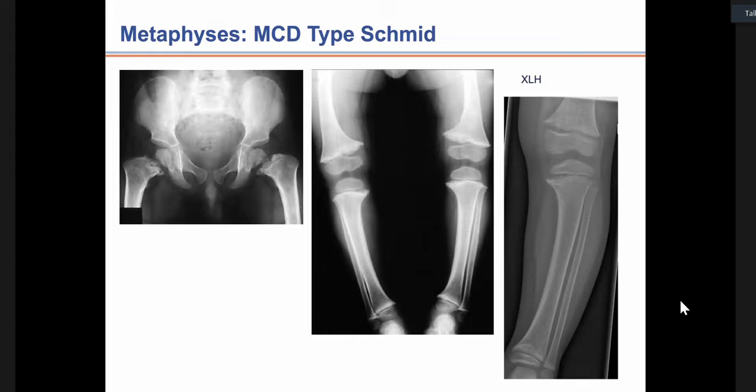And remember that hypophosphatemic rickets is not always X-linked, so that it can be autosomal dominant. And that also has this particular appearance on radiographs. So do think about, could this be hypophosphatemic rickets when you see the medial aspects affected in this manner?